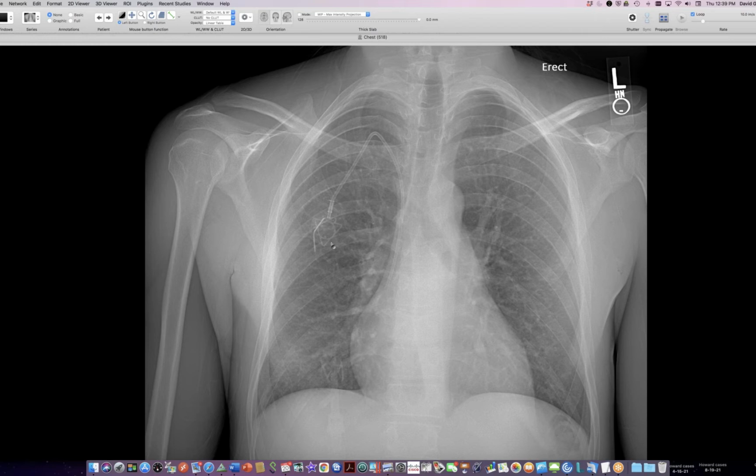No, it does look off. I mean, everything is straight on, as I can tell too. Okay, curious. Well, it's either an overcall or there was some subsequent adjustment. Maybe they just adjusted it and pulled it back in like half a centimeter and pushed it back in again, and it was fine. And didn't tell you something like that. Maybe. Okay. So, I think I will continue then to raise alarm when I see this sort of thing.